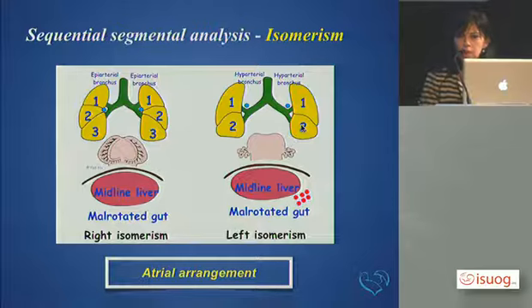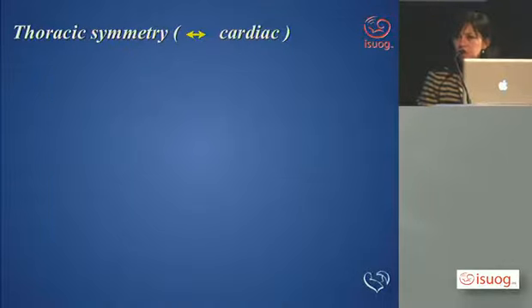That tells about the lungs, and that usually comes together with the morphology of the atrial appendages. So it's all very nice to be able to show them, but you don't necessarily need to see the morphology of the appendage on the ultrasound.